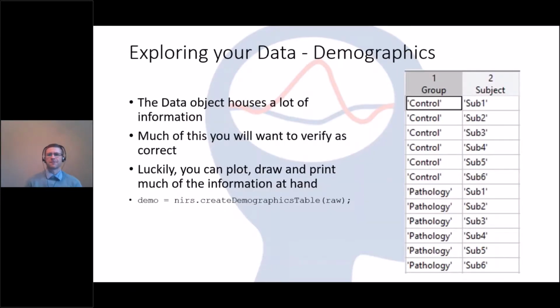So we've loaded our data. The first thing that needs to be done, and I think a lot of people skip over this because there's so much going on in the lab and you want to look at the data, is to check it. You think you loaded it right every time, and it's not always the case. So you want to make sure the structure's right, everything looks the way you expect it to look, and there's no weird anomaly or anything like that.